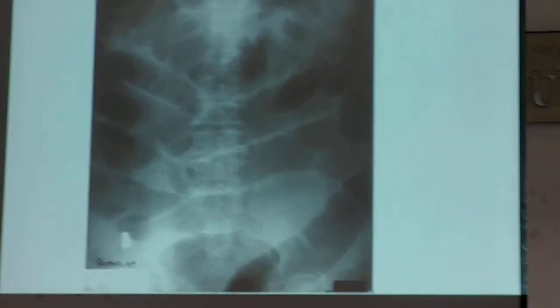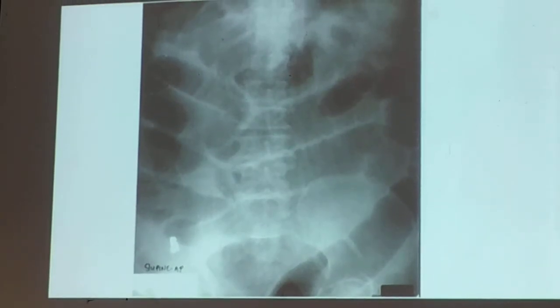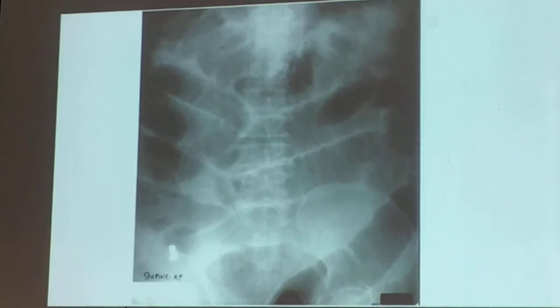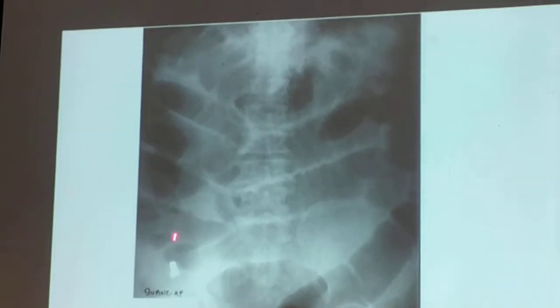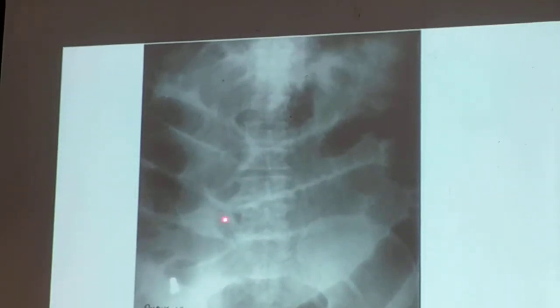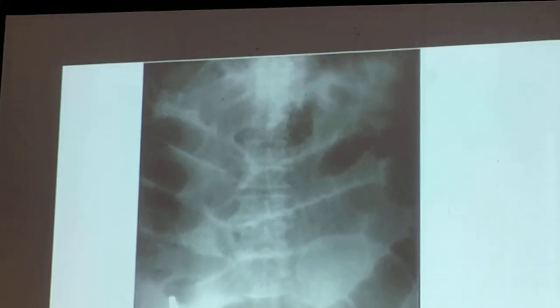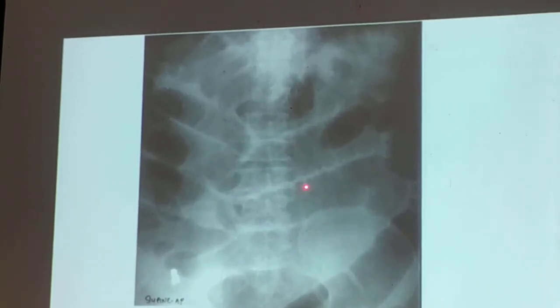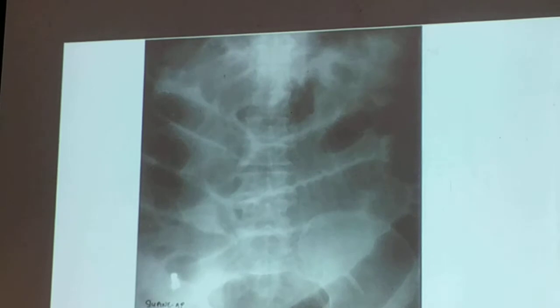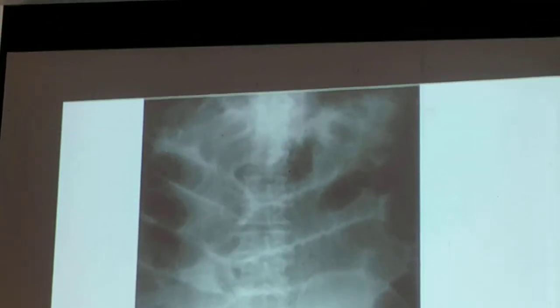There you are, another picture of your gas-filled bowel. So, again, hindi na lang siya sa periphery, nagsisigsag-sigsag na siya. Okay? And then, you could appreciate the simple haustration. In between, parang may mga guhit na puti.